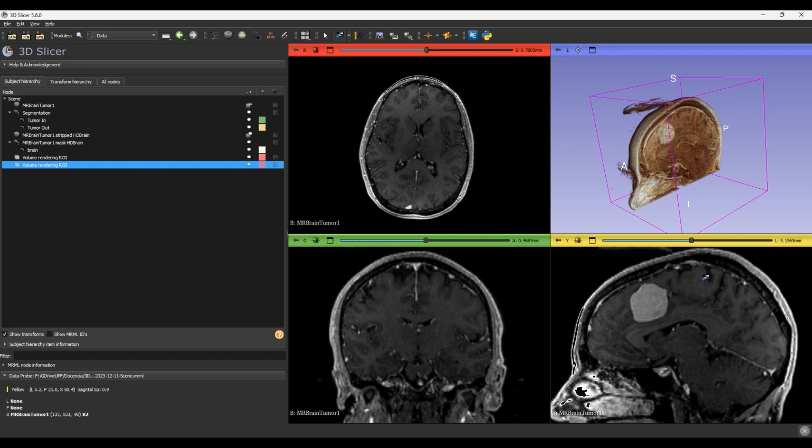Note how, in central slides from the sagittal view, by varying the display parameters, the bone tissue disappears. Select display parameters that show all bone. Now, let's start with the skull segmentation process.